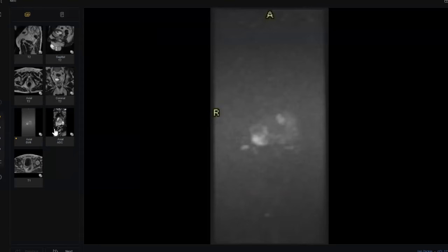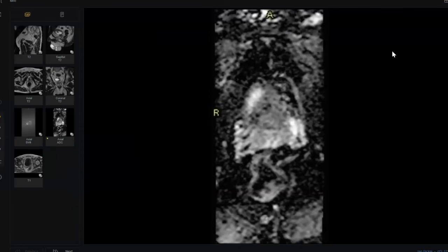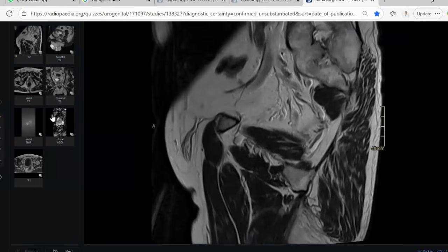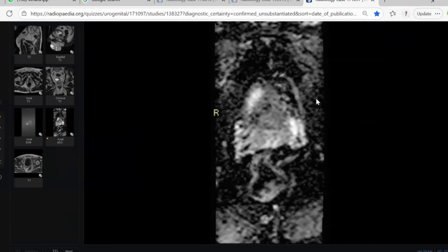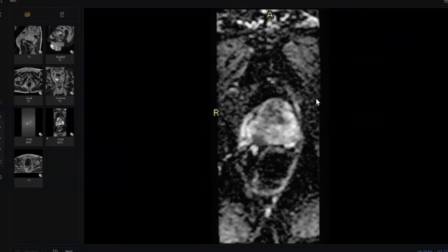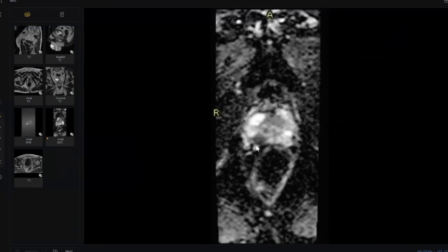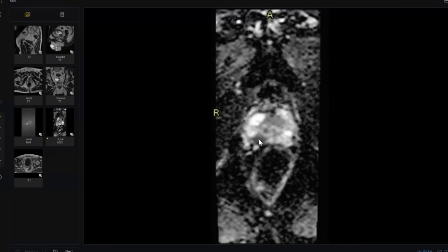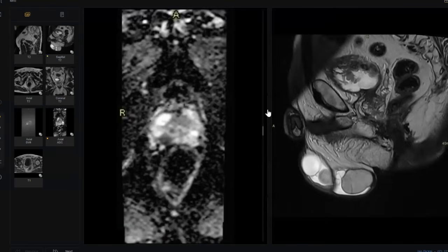If you want to examine the prostate, first catch the ADC. This is a very easy way. Catch the ADC, okay? And look for any low ADC signal. This is low ADC. This is the easiest. Look, click. Oh, I suspect this one. Okay, this is posterior, I think middle. This is right posterior zone medially, in the middle part. Check in the diffusion, DWI.